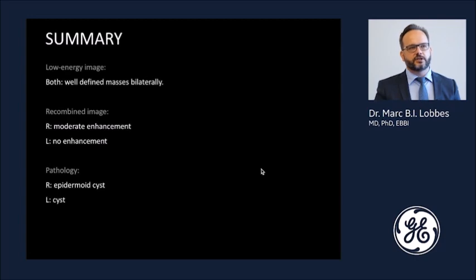So there was actually no need to perform an extra ultrasound, but in this case we performed it for teaching purposes. And on the right it turned out to be an epidermoid cyst. So again, some benign things can enhance, but at least the morphology was very benign looking.